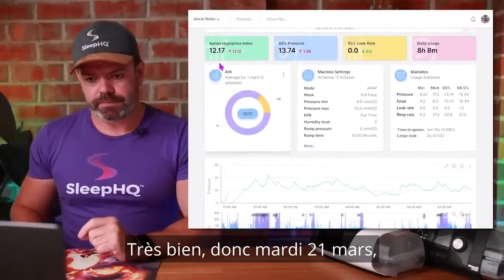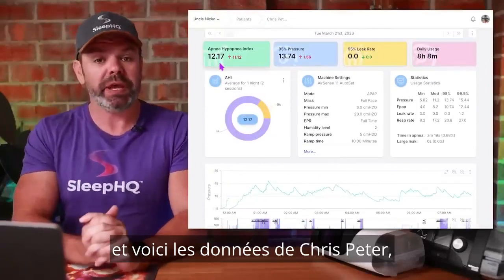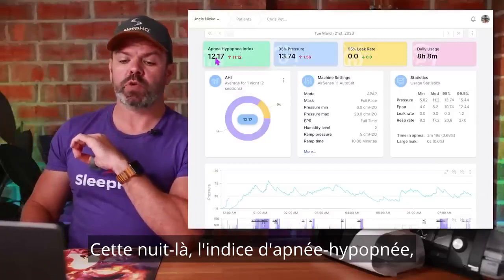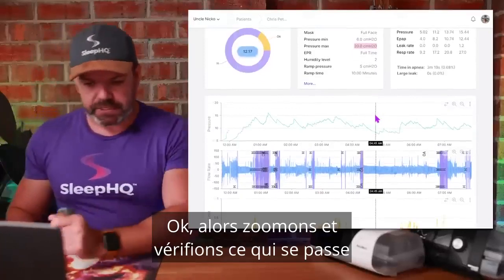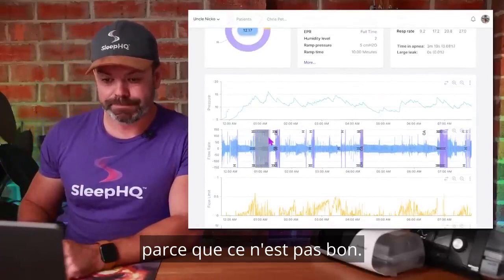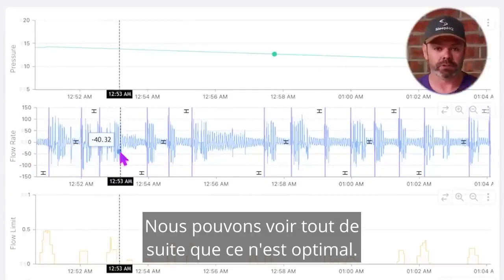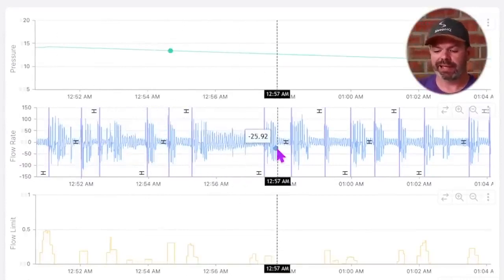All right, so Tuesday, March 21st, and this is Chris Peters' data, member on the SleepHQ Pro Community Forum. G'day, Chris. So on this night, apnea-hypopnea index 12.17, too high. Okay, so let's zoom in and check out what's going on, because it's not good. So to start, let's take a look at the breathing, the airflow rate. And we can see right now that it doesn't look great. We have all these purple flags here, the hypopnea flags. It's not stable, is it?